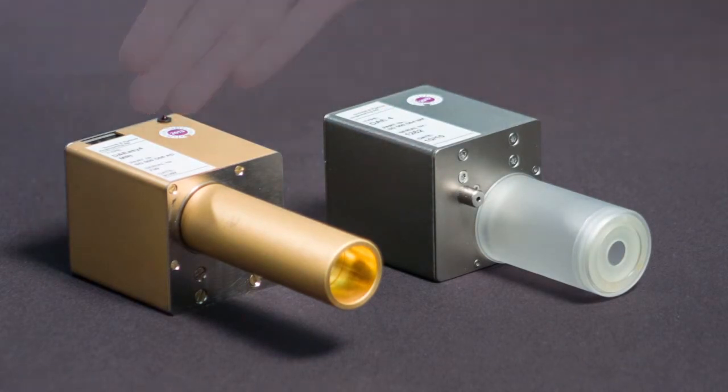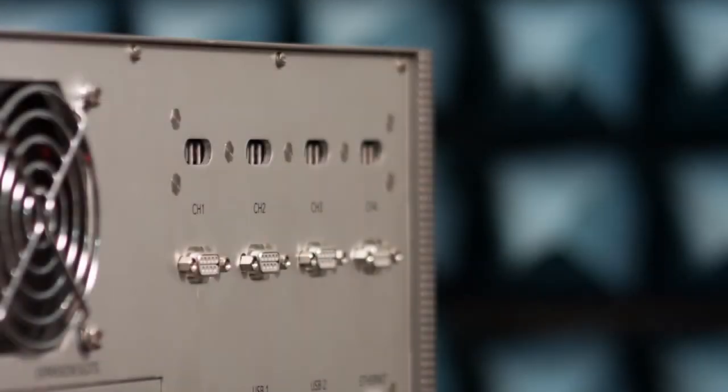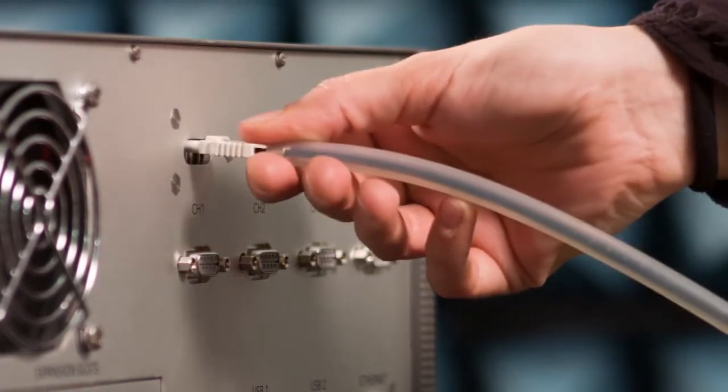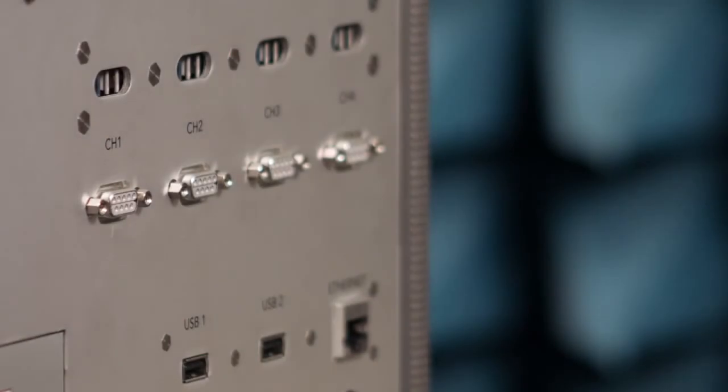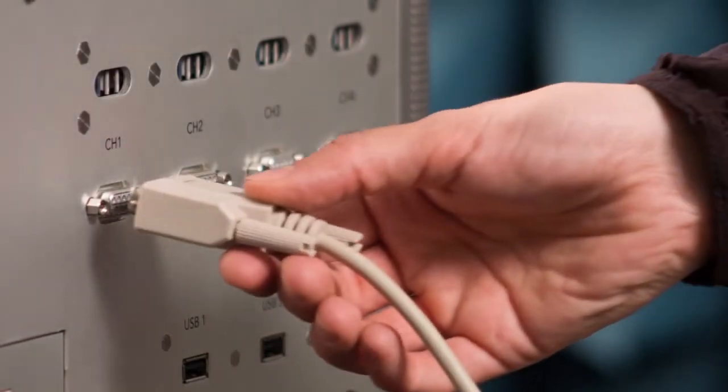The first is suitable for measuring normal electromagnetic compatibility environments, whereas the EASY4MRI has been explicitly developed for use in challenging MRI environments. All magnetic components have been removed and the mounting tube protects coupling to the probe connector. The EASY4MRI is connected to the EASY4 directly via a fiber optics link that can be up to 20 meters long, and the optical link can be further extended via the electro-optic converter.